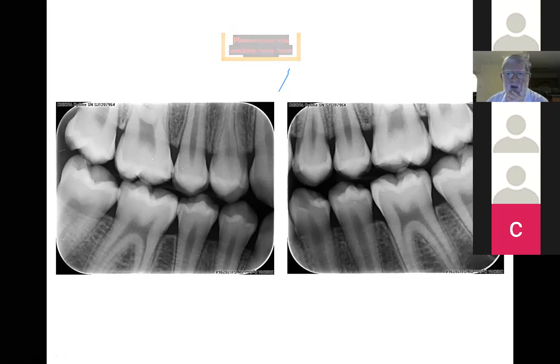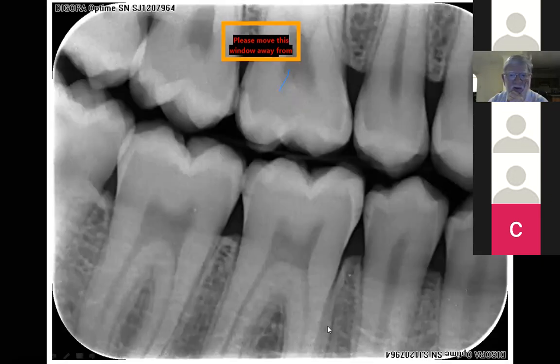Relatively new cases, brother and sister. Here's the sister, about 2 years younger than the brother. She flosses. Nice teeth, nice bone. You're seeing that lamina dura everywhere. Really looking after teeth. She flosses. Brother, big brother, doesn't floss. Could he be running into trouble? And where?